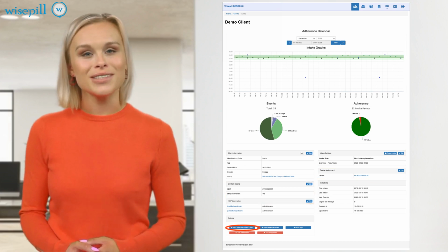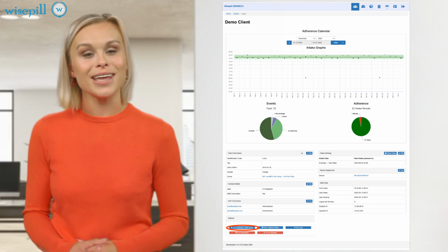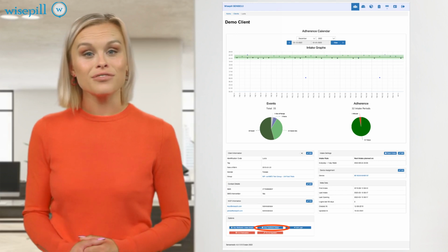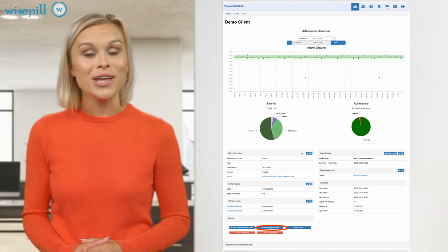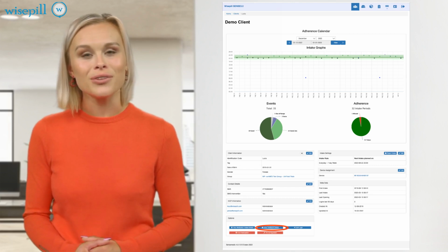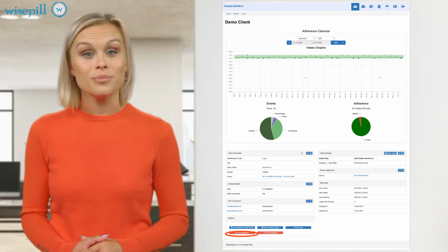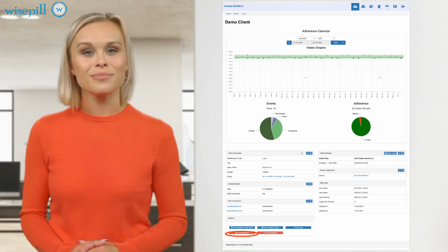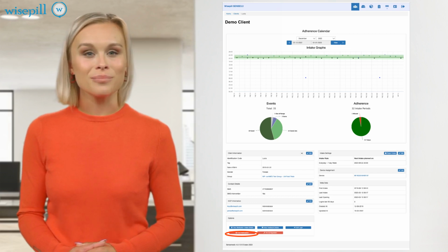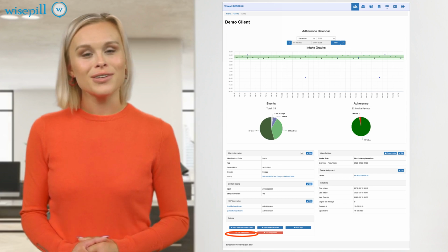View medication events. A list of all events for this client, including medication intakes and battery status. View feedback. A list of interventions, which are sent via SMS or email to a client or caregiver, are shown here. End participation. When a client is no longer using a pill dispenser, an administrator can end a client's participation by choosing this option. All intake recordings and interventions for this client will be stopped, devices unlinked, and the client will effectively become read-only. This step is not reversible.